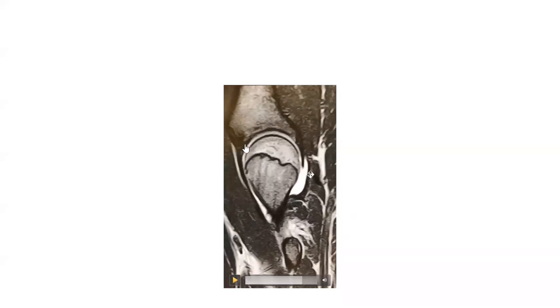And the labrum is a tiny little triangle right there. I don't know how people say that it's torn on an MRI of the hip, but they do say that often. You have to correlate it with the patient's complaint. No image is meant to diagnose every problem, okay? You don't just get an MRI to find out. You come up with a good differential diagnosis of what you think is going on, and the MRI or the CAT scan or the X-ray is a tool to help answer the question and differentiate yes or no on a few critical questions that you have, okay?